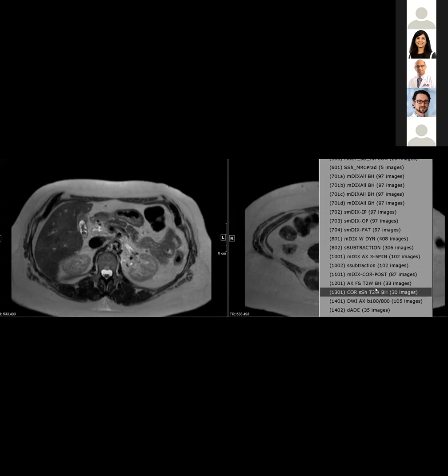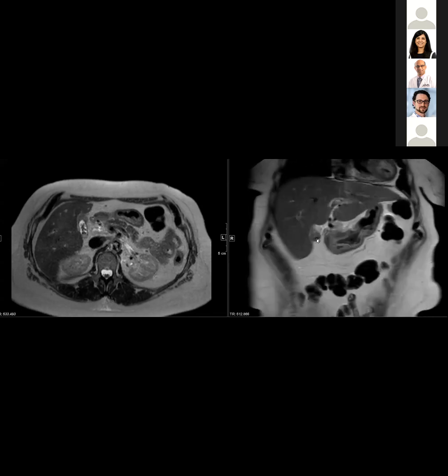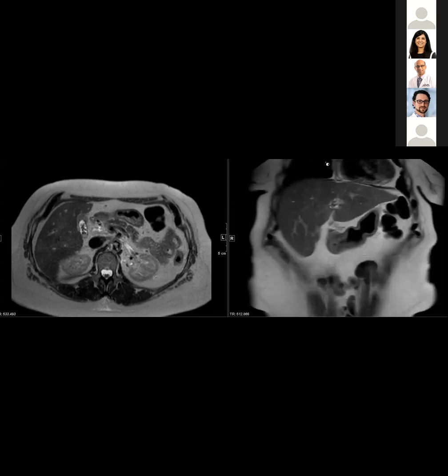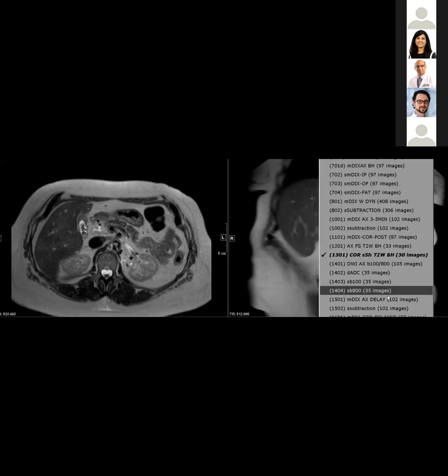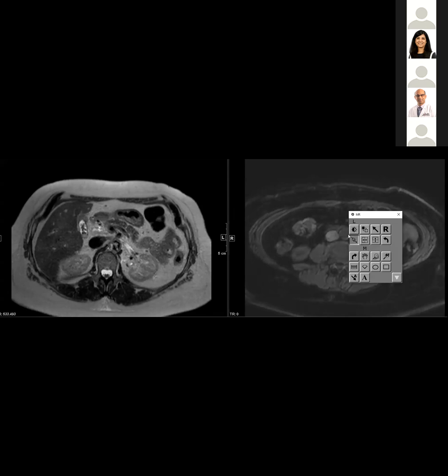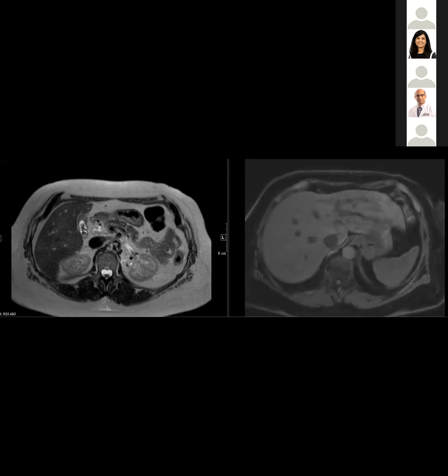Do you have a coronal, so that we can look at the fundus? Yeah. So you can see this right here. Did it enhance at the time, Victoria? It did. Yeah, to me, it's looking more suspicious, either chronic cholecystitis or cancer. So here, this is it on the.